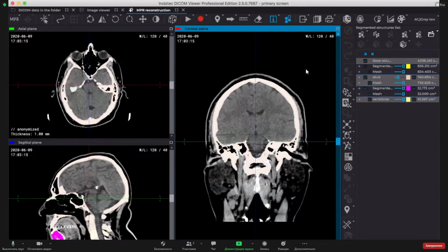I guess it was about checking or unchecking those boxes where you can make the volume rendering and the mesh visible at the same time. Oh, okay, we can try that. Yes, you can show that, and it's available.